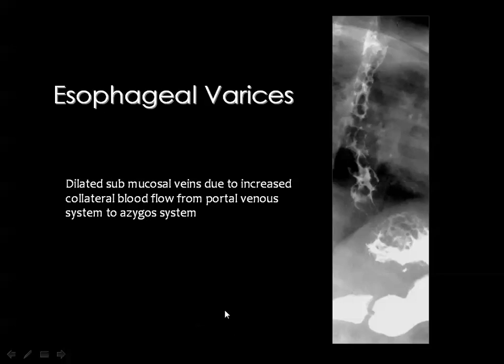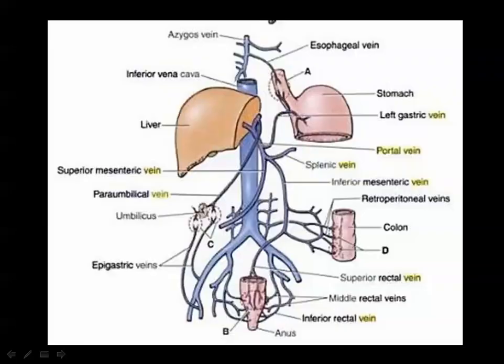Then esophageal varices are the result of portal hypertension with dilatation of the portosystemic collaterals, and usually produce worm-like filling defects in the esophagus. This can be easily identified by barium, and also on CT scan. And you know that there are two types of esophageal varices: the downhill esophageal varices, which are relatively uncommon, and the uphill esophageal varices, which come from lower down.